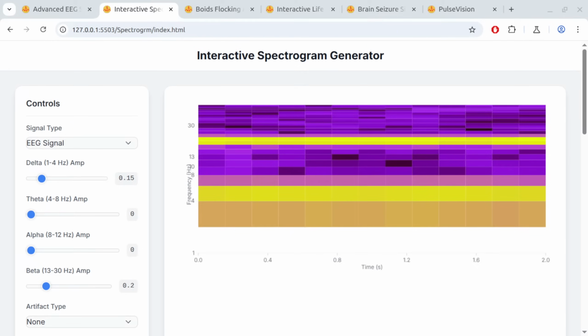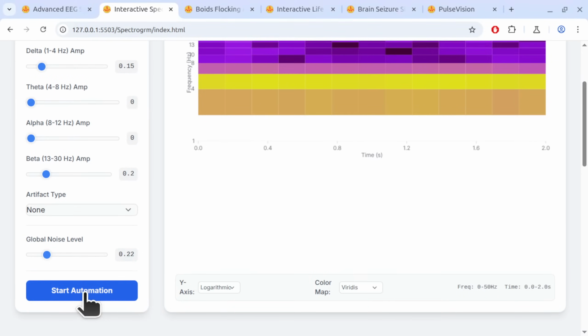So can you explain what the problem might be? The issue might be that the logarithmic scaling is not fully utilizing the available vertical space. Logarithmic scales tend to compress lower frequencies, which can leave empty space at the bottom of the spectrogram if the scaling parameters are not optimized for the specific frequency range being displayed. Adjusting the scaling parameters or the y-axis limits could help to utilize the space more effectively.